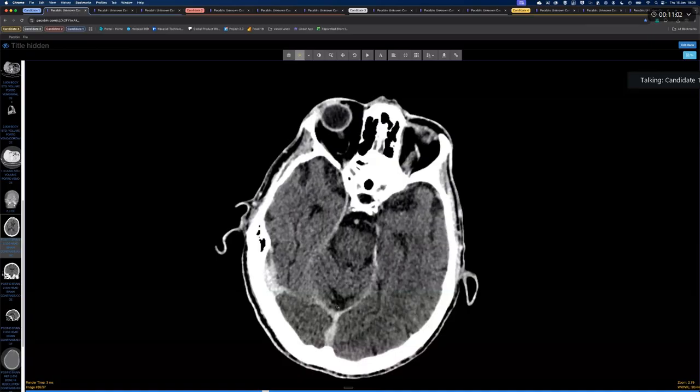They are enhancing as well. Ring enhancing lesions can be, can't they? Yeah. Okay, so more possibilities could be MS, yes, active plaques. So better to go for MRI for further characterization of these lesions.